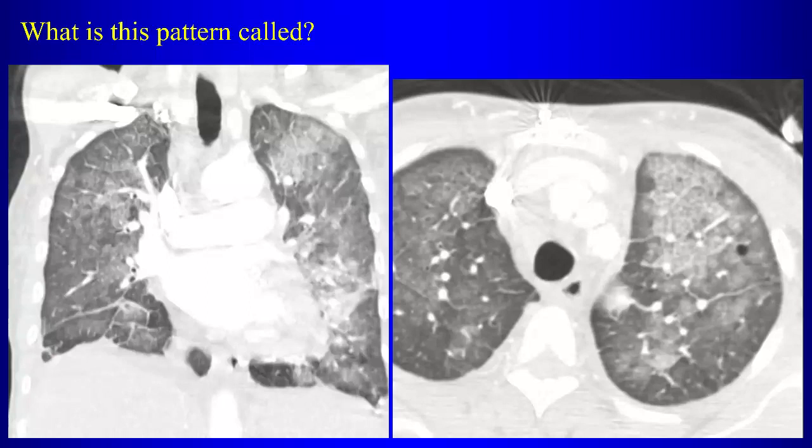Yeah, you're thinking about pulmonary alveolar proteinosis. Of course, that in the textbooks is associated with crazy paving, right? So certainly you should have that association in your mind. But is that the most common cause of crazy paving? If you see it in clinical practice, it's going to be what? Pulmonary edema. It's just going to be plain old pulmonary edema.